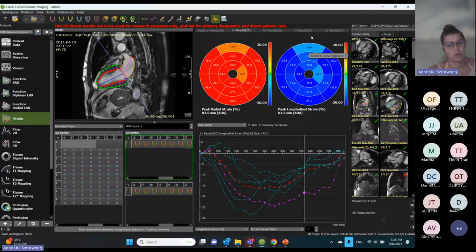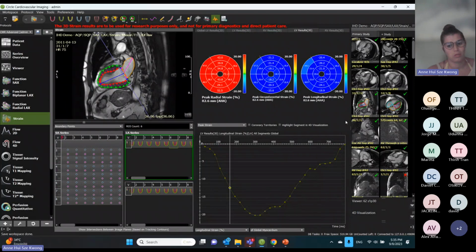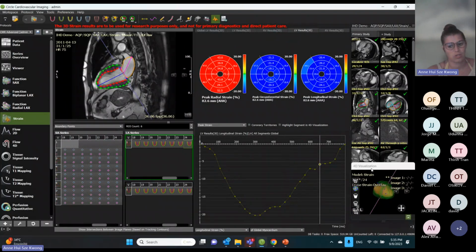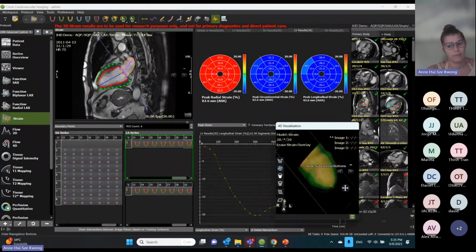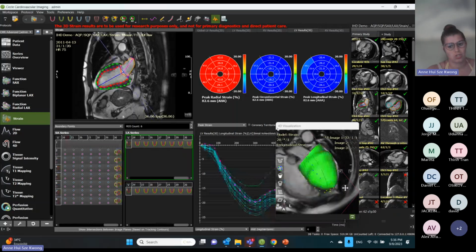And if I want to go now in 3D, I could have the 3 different strains using the combination of all the different series of images. And I could have a 4D visualization here. If I want to see the 4D volume here, I can drag it behind the scene if I want. And I can look at each strain.